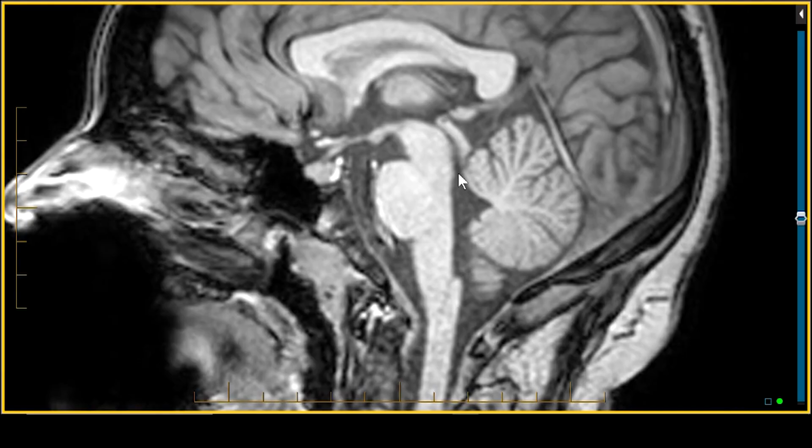Let's take a look at the cerebellar vermis on the sagittal midline with some magnification. Just to get us oriented, here's our fourth ventricle with the fastigium of the fourth, whose shape and pointedness and size we pay close attention to. Here's the inferior recess of the fourth, the floor of the fourth, where you'll find the facial colliculus bump, the inferior colliculus, the superior colliculus, the posterior commissure, the habenula, and the pineal gland. Behind the cerebellum is the straight sinus, and above it the vein of Galen, the tentorium cerebelli, and the falcotentorial region coalesce in this position.